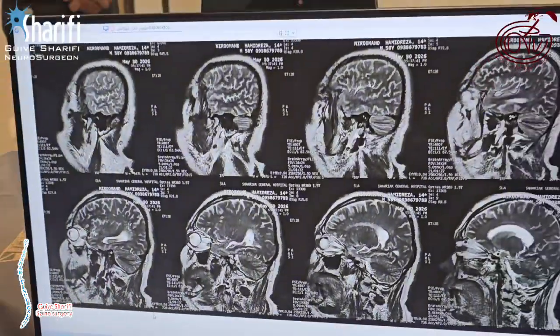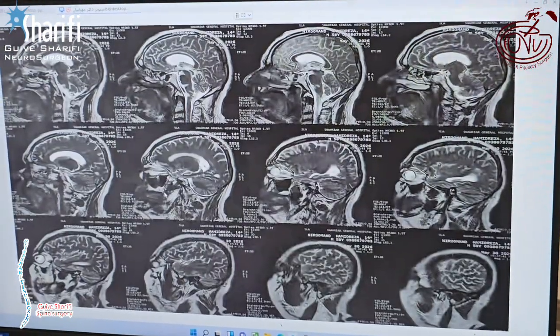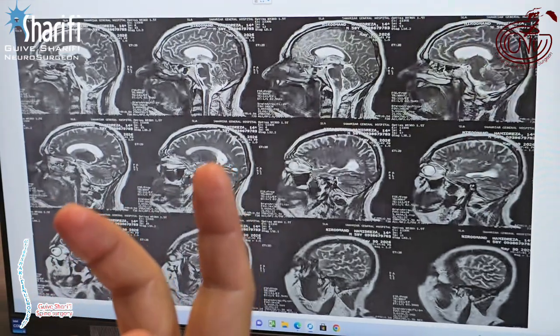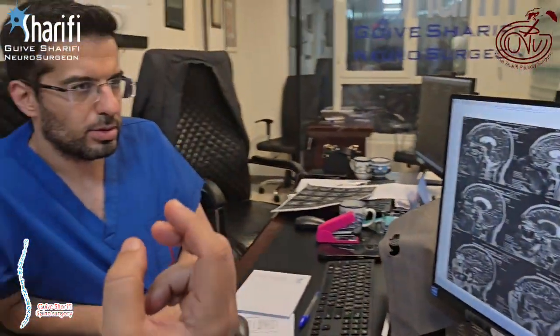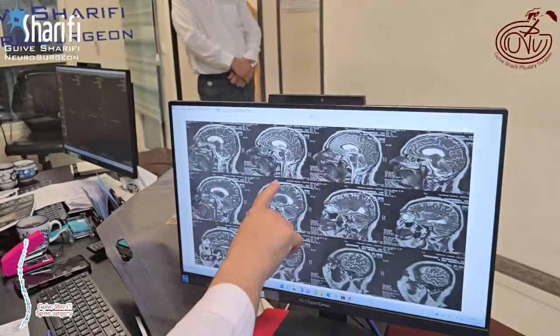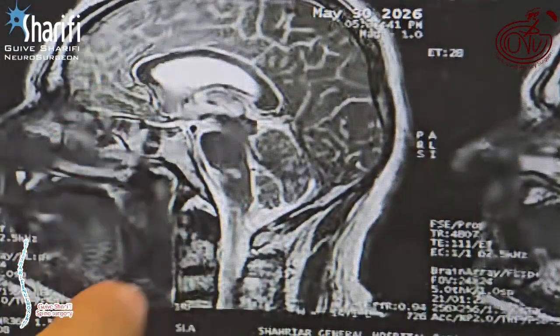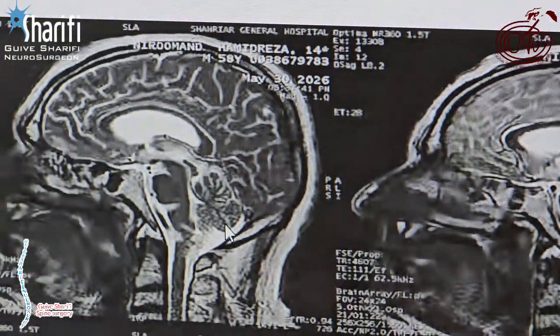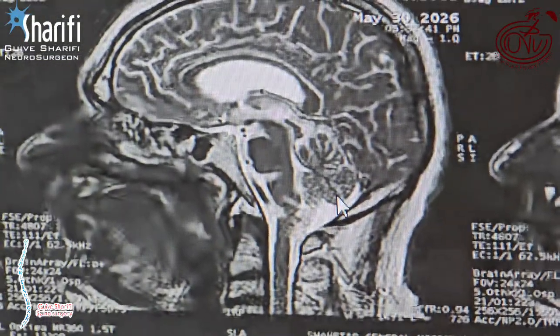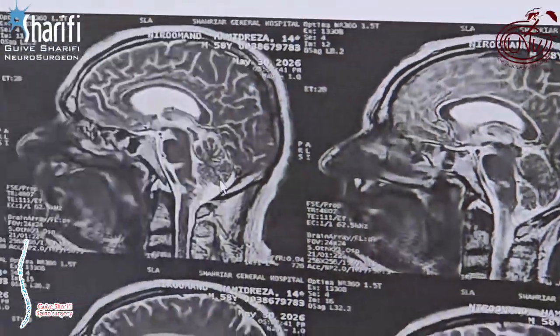And here you can see the post-op MRI. No remnant of those. It is very good that Dr. Sohail performed early MRI. Comparison with the previous large T2 needed. This is the postoperative MRI. You see all of the veins that we saw previously around the brainstem with high flow void have now disappeared, and they have collapsed, and it is very good to perform this early MRI.